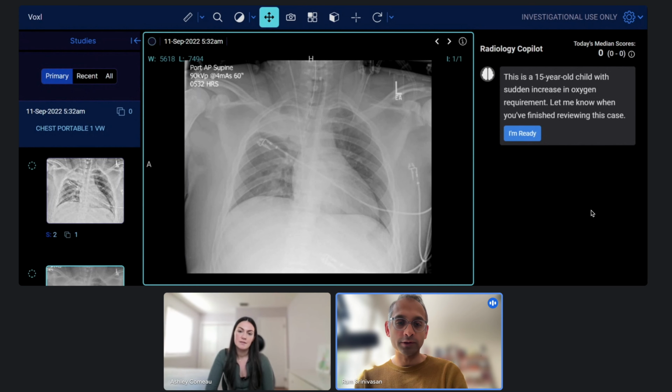Ashley, you've just finished the RadClerk rotation, including both chest and MSK rotations, and thank you so much for meeting with me today and getting a chance to share with everyone else out there what you learned during the rotation. Let's just go ahead and do some cases. Tell me about this patient that you're looking at here.